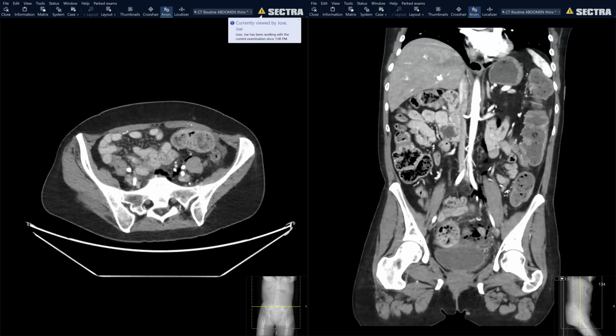And it seems like since that tumor is causing it or blocking it, they probably don't even need to anticoagulate because it's auto-blocking it. And it's just one branch. Oh, I know. Yeah, I never know. Sometimes they do anticoagulate these, sometimes they don't.